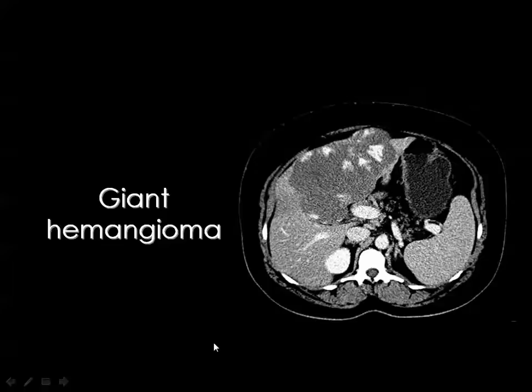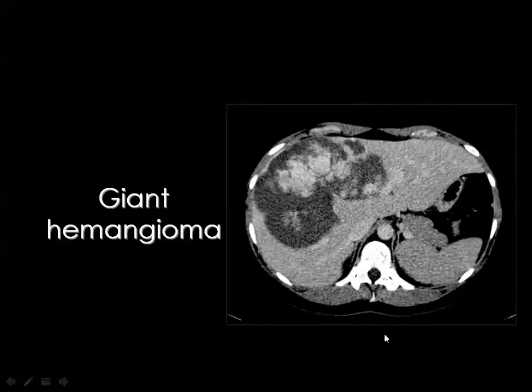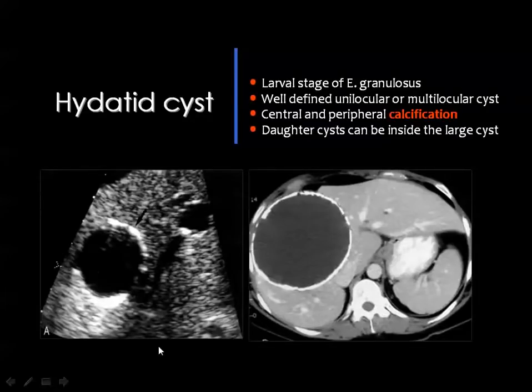And this giant hemangioma will not fill totally with contrast media because of the presence of thrombosis in its central part. This is also an example of a giant hemangioma occupying part of the left lobe of the liver as well as the right lobe. Then we came to the fourth one in this category, which is the hydatid cyst.